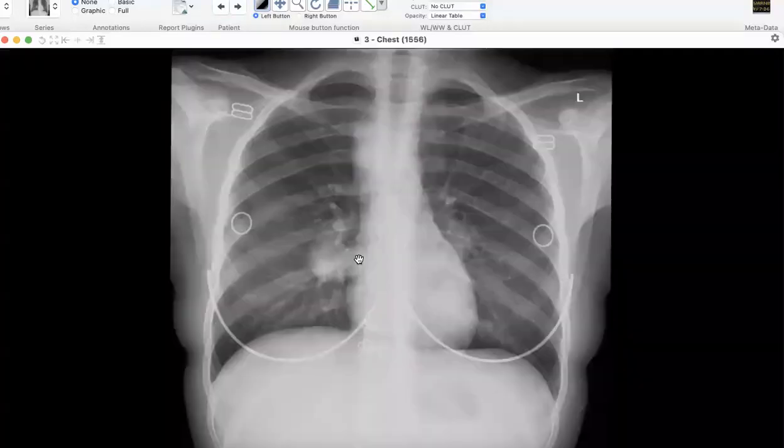So this is a young female patient who has presented with history of fever and weight loss. Okay. I've been provided with the chest X-ray of the adult patient. There is a right hilar mass, very prominent right hilar mass, and I can't see any consolidation or any changes around the mass. There is no pleural effusion, no pneumothorax, and no other mass in both lung fields. The heart has a normal shadow, the trachea is central.